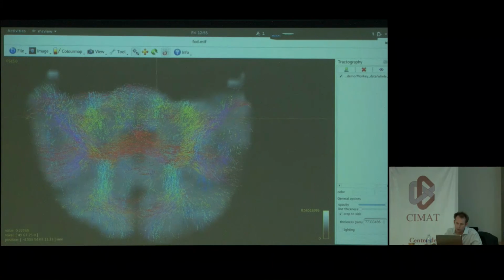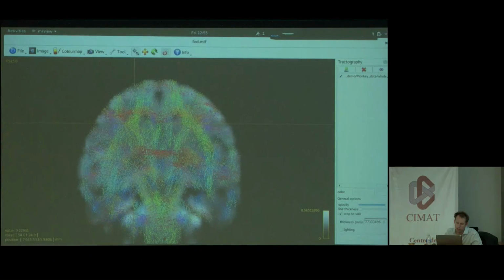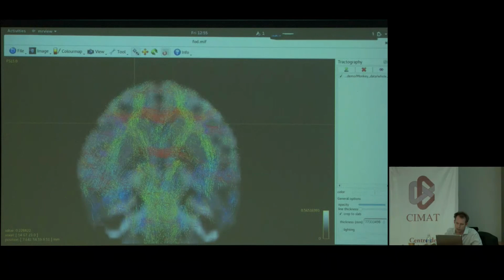I think there's a lot of noise here, but that's probably okay. That's the fat, so I'm just going to ignore that.